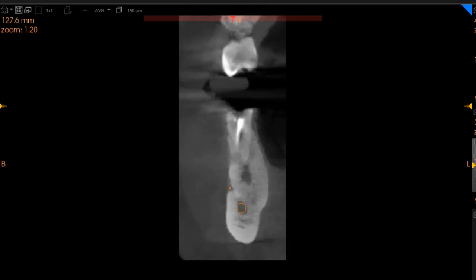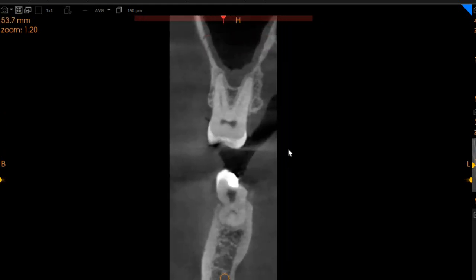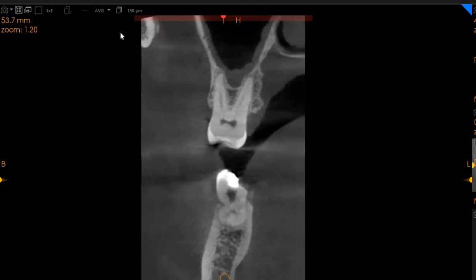The lower left 5 also has a periapical radiolucency, as you can very clearly see, periapical radiolucency right at this point in the lower left 5 as well. The doctors asked us to evaluate the upper right 7 as well. So the upper right 7 for crack, we don't see any periapical radiolucencies, we don't see any PDL widening of sorts.